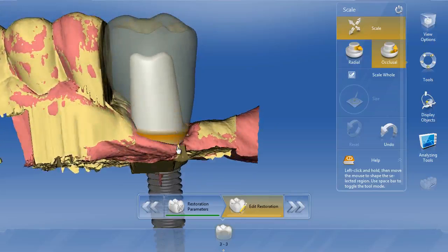But you cannot bring that down to the level of the tissue, otherwise the crown will not fit into the block because the crown is so long. The other option is you could make the abutment down to the level of the tissue, but then you would have to make a lab fabricated crown in order to fit that in there, or mill something and then stack a layer of porcelain on top, which is not a good option. So what this dentist did was correct. It's an interesting case, just in case somebody runs across a scenario like this. The design was done right, so good job.